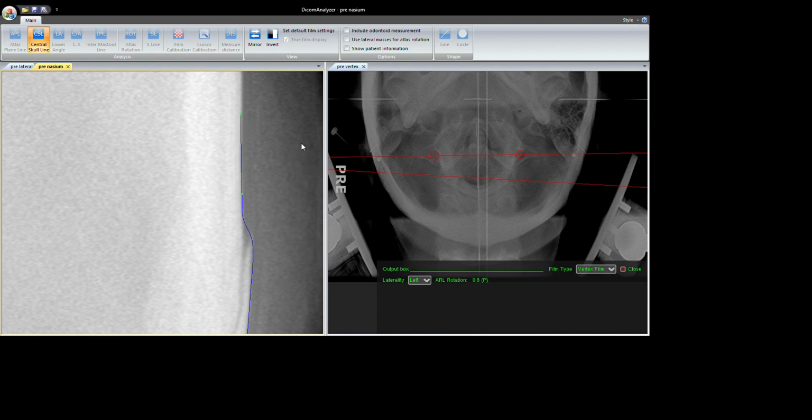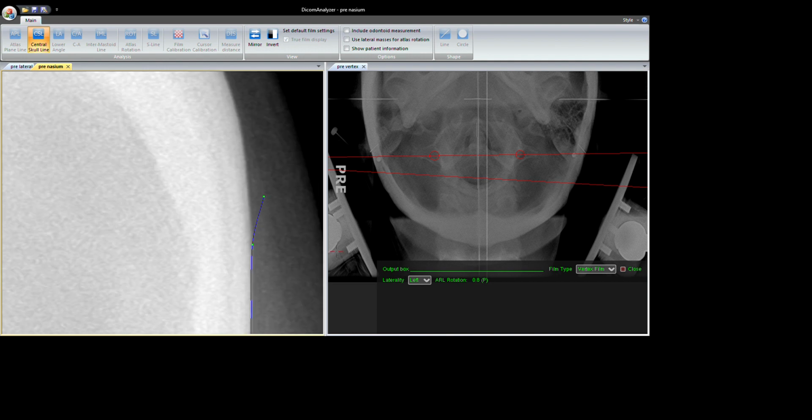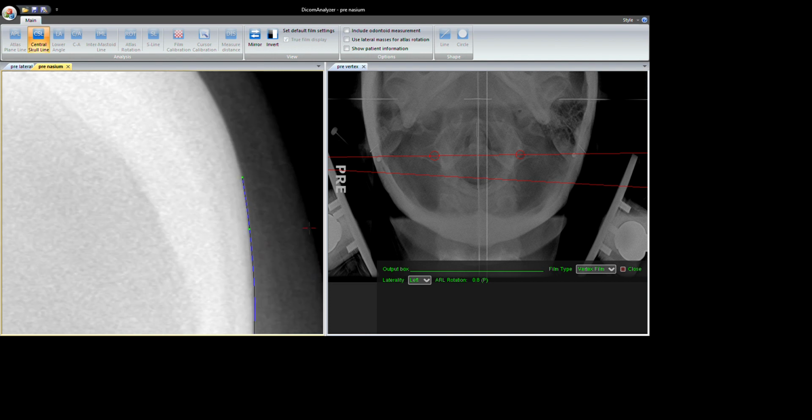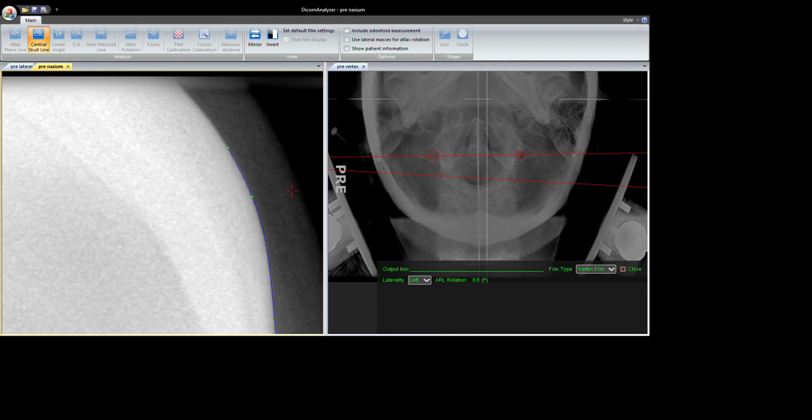There. And then continue on. And generally we're going to either want to analyze widely across that area or not at all using that area, because that's obviously a place where we're not actually looking at the edge of the skull, we're looking at wherever we drew that connection across. I double click the last one, now it's done.